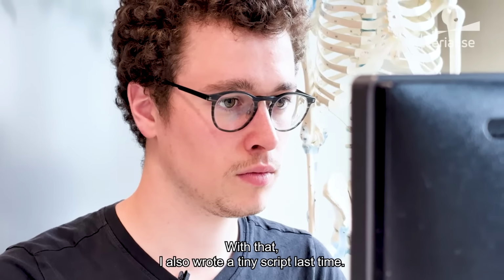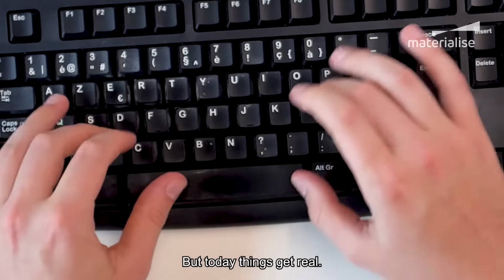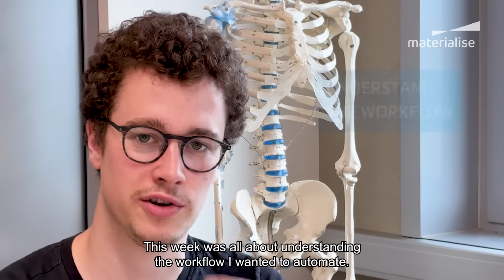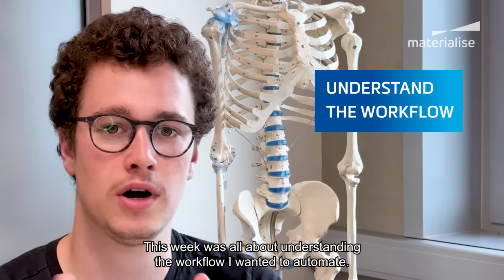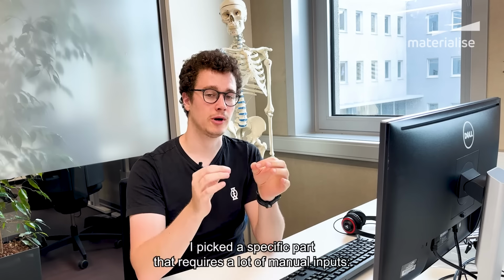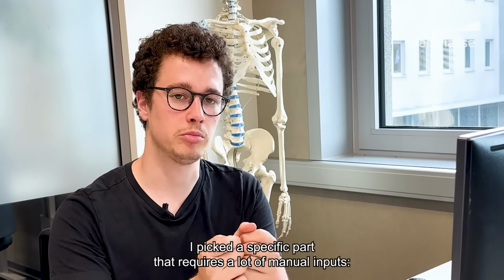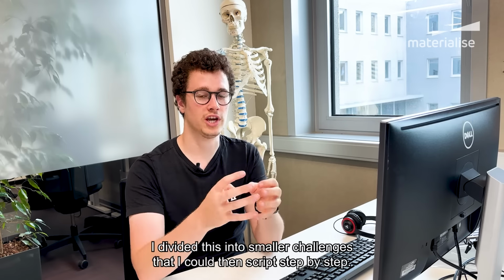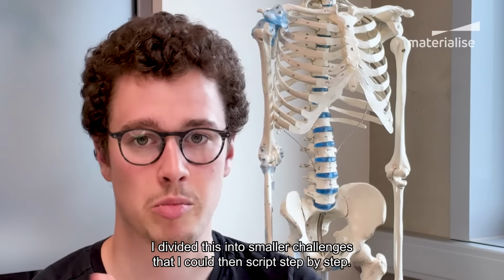With that, I also wrote a tiny script last time. But today, things get real. This week was all about understanding the workflow I wanted to automate. I picked a specific part that requires a lot of manual input, designing the surgical guides. I divided this into smaller challenges that I could then script step by step.